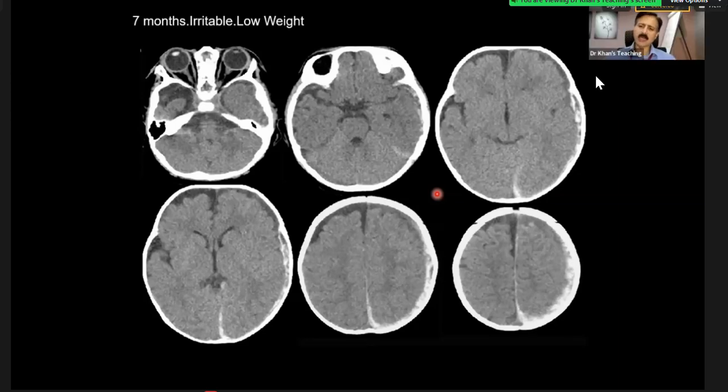Excellent. So I'm not showing you NAI for the simple reason we have covered it in the PED section, but one case I just wanted to show you what is happening is acute over chronic subdural, which goes all the way here. And then another finding is that if you see here, there is atrophy of this temporal lobe. This is not an arachnoid cyst. You can see it is atrophic. And with this kind of unifying diagnosis, there might have been a previous contusion, and now there is a bit of focal atrophy. So this is NAI.